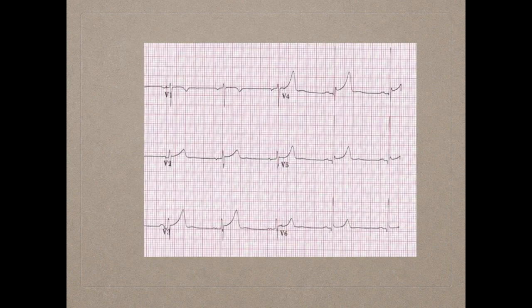The next thing we want to look for are signs of hypertrophy. Although there is like a gazillion different rules for learning what could constitute left ventricular hypertrophy or right ventricular hypertrophy, let's just keep it simple here. If you were to do the Sokolow-Lyon criteria for left ventricular hypertrophy, that's adding the height of the R wave in V5 or V6, whichever is taller, and that would be V5 in this case, to the S wave in V1. Is it greater than 35 millimeters? The answer is no. Simply put, this patient does not have left or right ventricular hypertrophy.